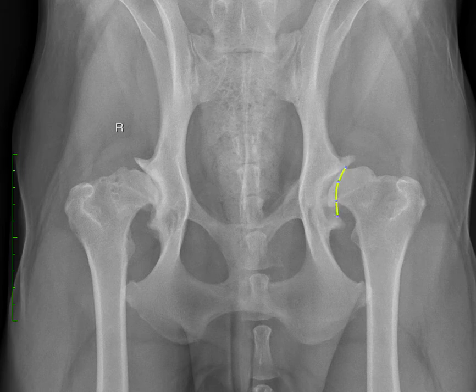On this side, you can see that essentially only a whiff of the femoral head, and certainly well less than 50%, is covered by the acetabular margin. On this side, it's a very similar status. That's how I assess coverage. In this instance, I would say the coverage is poor, which tells me that there is subluxation of the hips, that the ball of the femoral head is not within a socket of the acetabular cup.